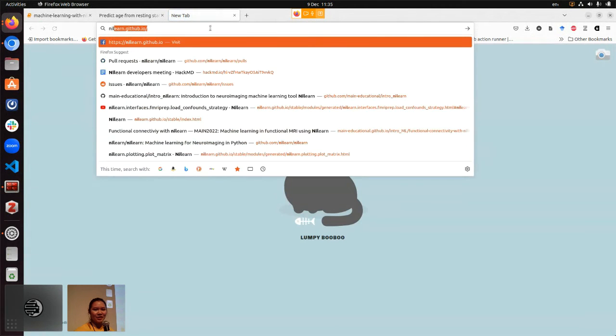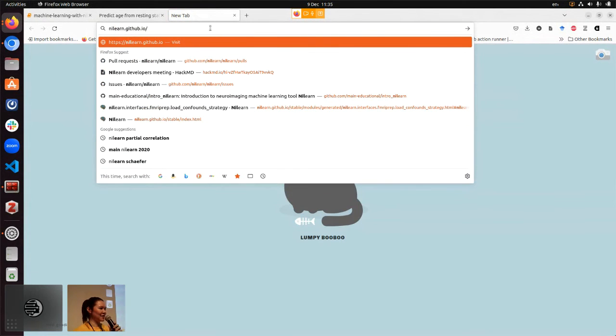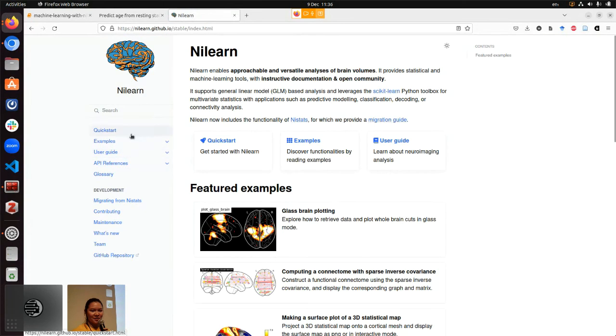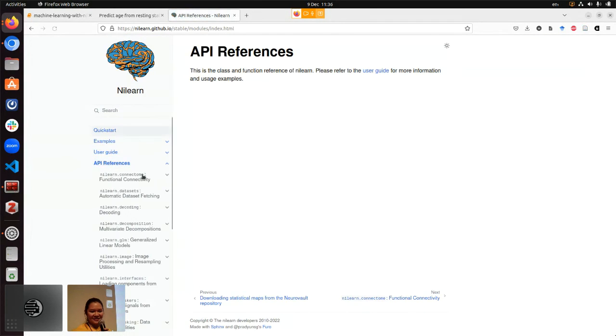Maybe it has a better function. Alexi, do you know if there's a better function? Yeah, for thresholding. If you only want voxels that have the value 1, I think it's math. Yes. Yep, because I still don't know everything about this.